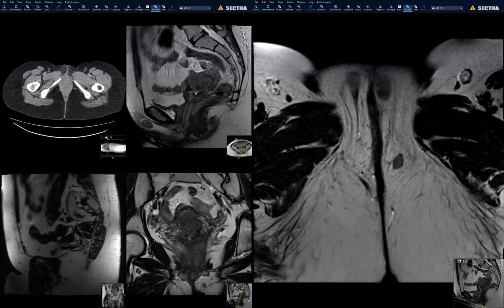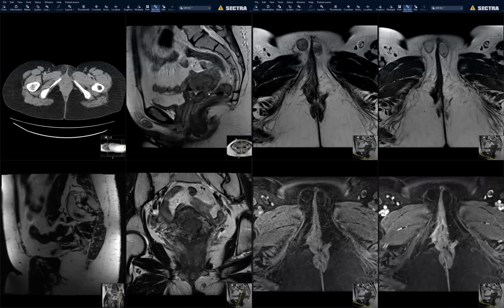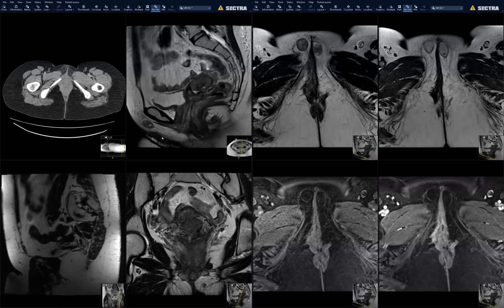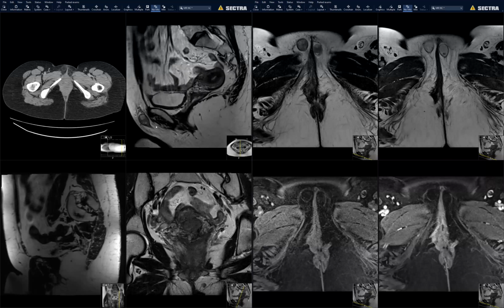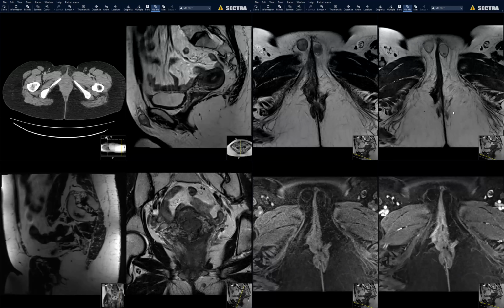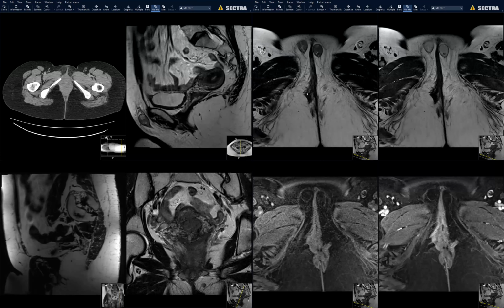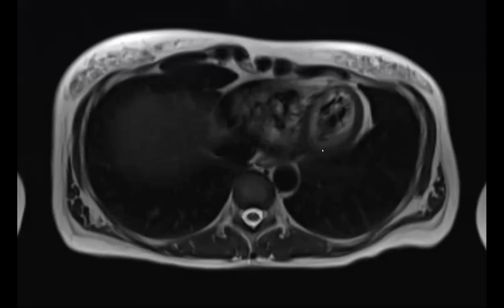So what's going on with the uterus? Is there a cancer? Oh, okay. She has a known tumor. That's different. This was incidentally seen, and we had no idea what to call it. Given that gray appearance on the T2, I might have wondered if those are nodes or some kind of mets. But on the CT, I'm really convinced that they are fat. So maybe just kind of weird fat necrosis.